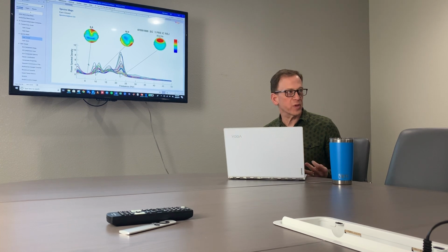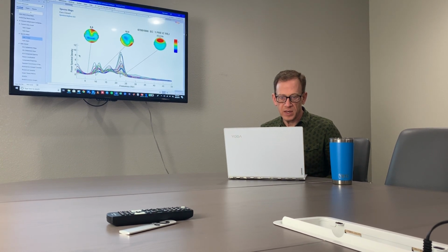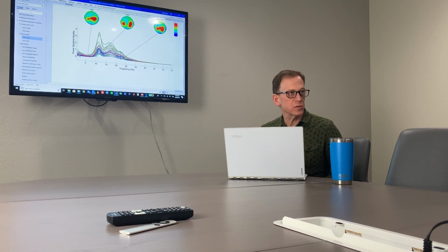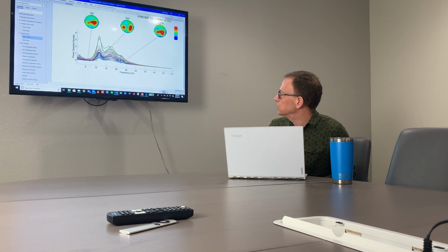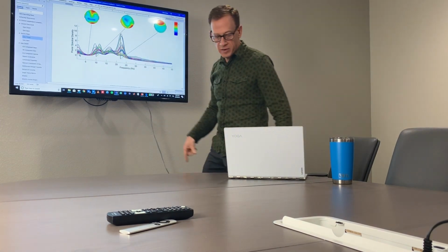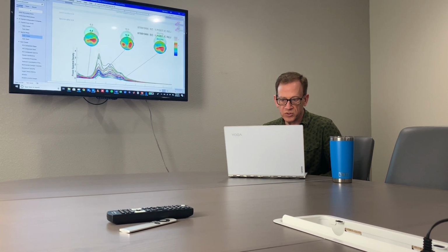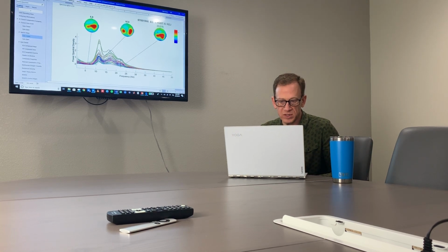This is before we applied ICA for artifacting, and this is what happens afterwards. So you can see there's a sizable difference in activity you see in the very low ends and the higher ends, which are actually artifact. So it changes our EEG, and now we look at more the pure EEG itself.